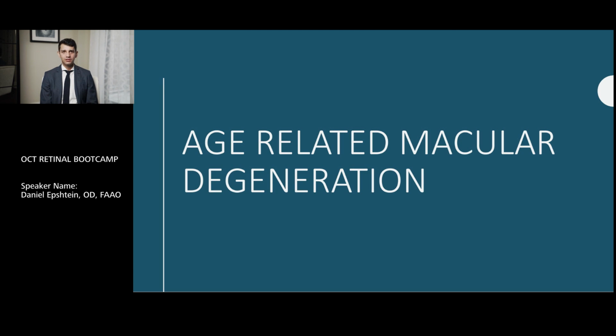So looking at AMD, we all have these patients, and drusen is an interesting term because we call a lot of things drusen, but we can actually subdivide them a little bit.